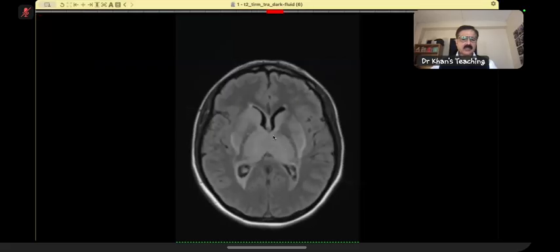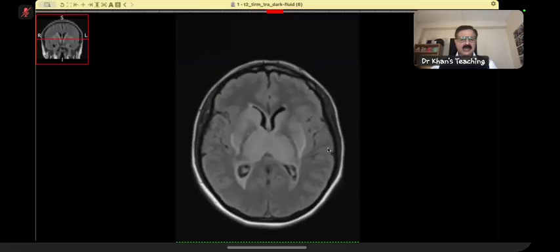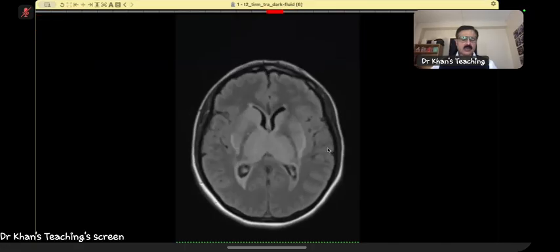Now, you see, this is the foramen of Monro, and even the aqueduct might be compressed. Bilateral symmetrical basal ganglia are involved, and the thalami are involved. Whenever there is bilateral thalamic involvement, the differential diagnosis should be very clear. Your differential with regard to infections was good, but you did not cover dural venous sinus thrombosis. Also remember artery of Percheron infarction, where both thalami are involved.